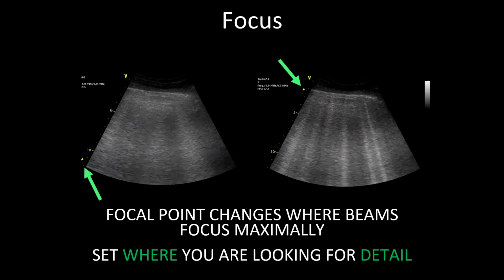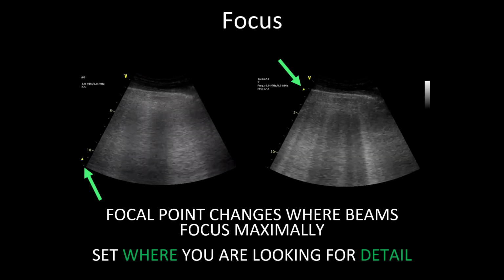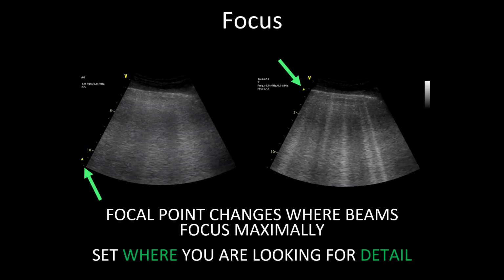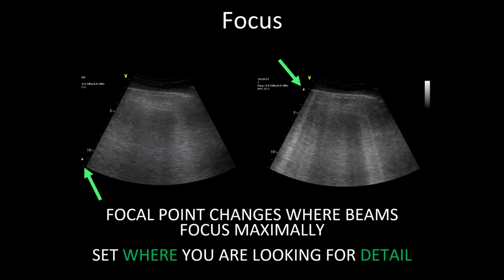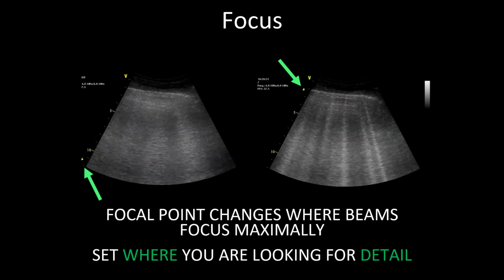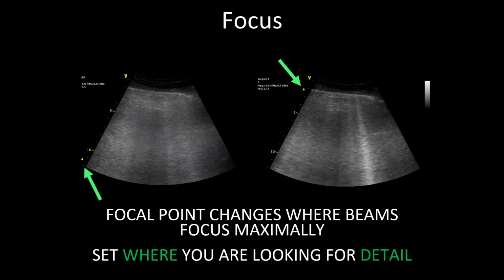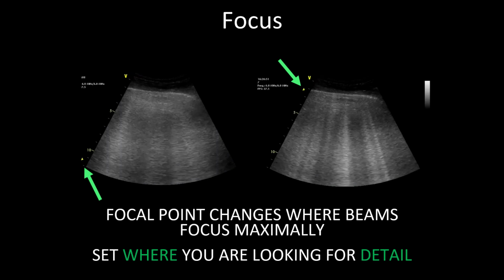This specific case is a pleural lining assessment performed using an abdominal probe. On the left of the screen, you can see a marker along the depth scale that reflects where the focus point is. This is improperly placed and will decrease its sensitivity to pick up sliding as well as potentially hide artifacts emanating from the pleural lining.